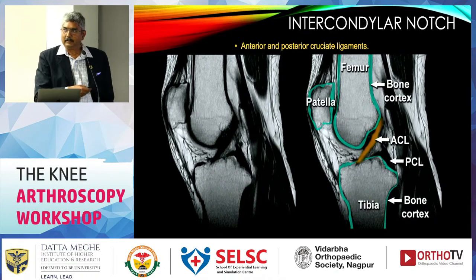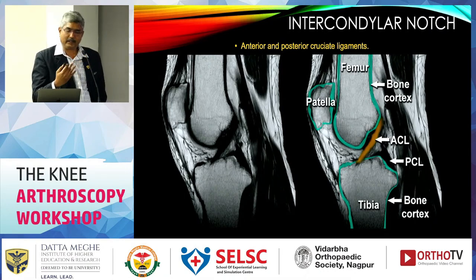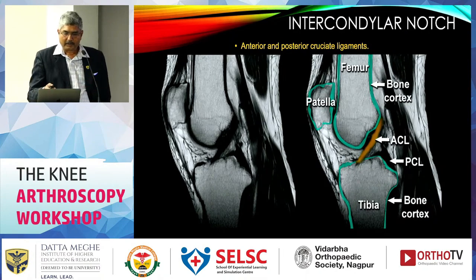PCL is again a similar thing. It is arising from the posterior part of the tibial intercondylar notch. It is crossing the ACL, coursing in a cross-like manner and getting inserted on the medial condyle of the femur. So such a simple thing are ACL and PCL.